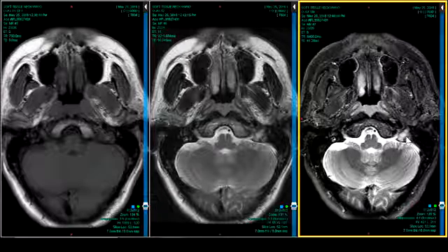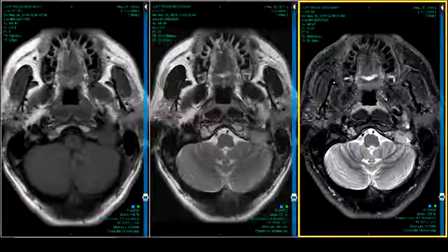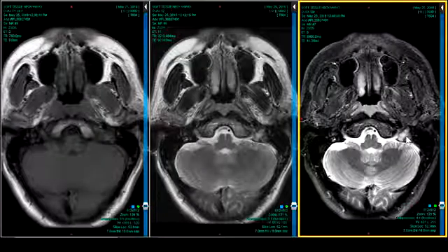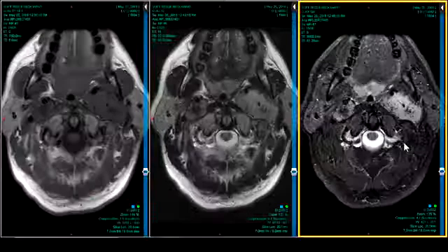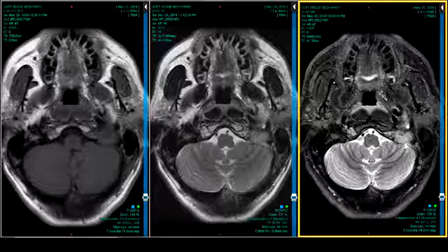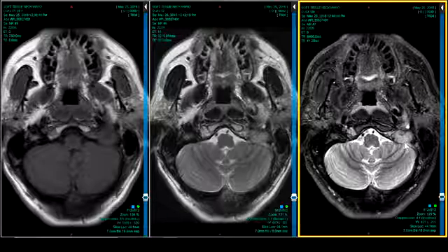Now, these glomus jugulare invade the jugular vein, and that's part of the difficulty in management, because what you've got to do is go above and below, and 9, 10, and 11 are right here. You want to save those. So this is a day's work right here, and managing the vein, you have to get down below it, here above, and work your way. So, big case, but they may want to get an MRV and see what the status of the vein is.